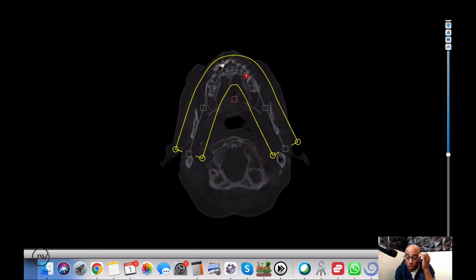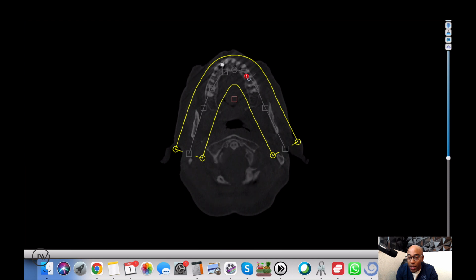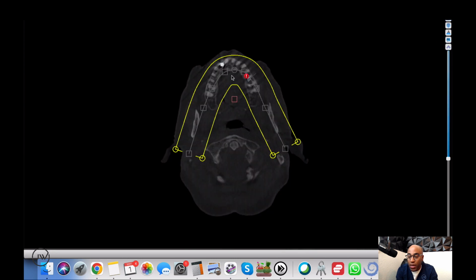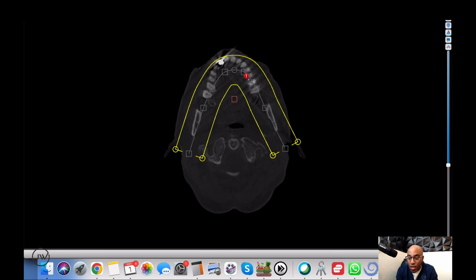And so we're going to work our way coronally towards the crown, which means we're going from here down, and we just want to make sure that this implant's completely encased in bone. And you can see the implant should start getting larger and larger until it's no more. So right now we're at the occlusal surface.